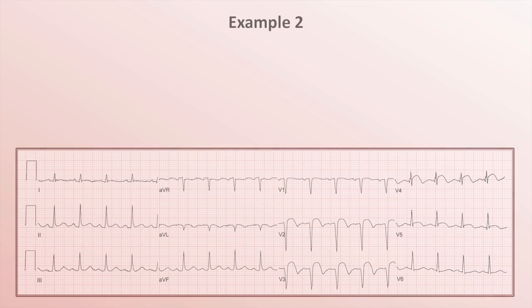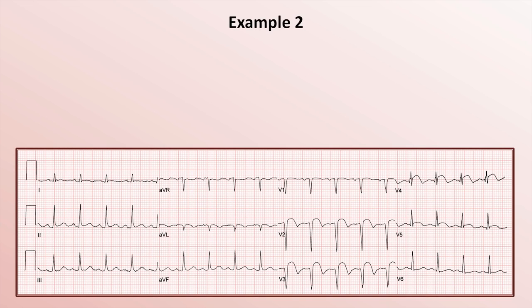Here's another example. Consider pausing the video here to give yourself a moment to look over it on your own.